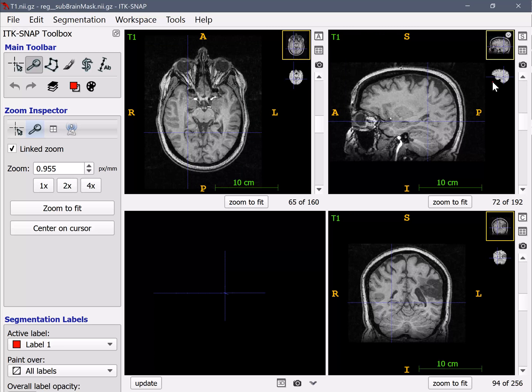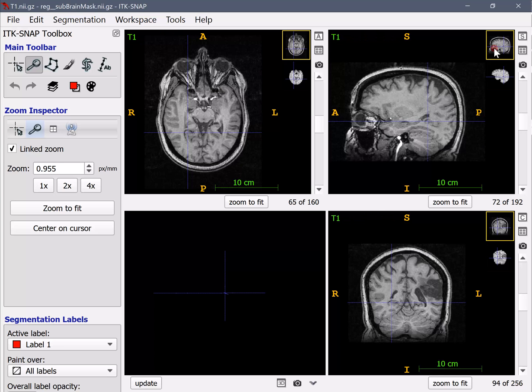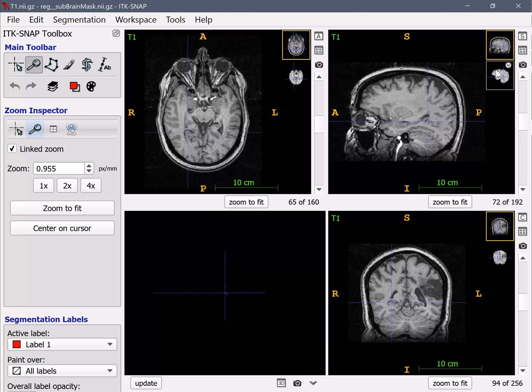We apply kind of a soft denoising because some images might be perfectly clear and nice. They might be obtained from modern scanners in 3T, others may be a little more noisy. Currently in LESYMAP, in the registered lesion to template function, I haven't put any option to choose how much denoising you want to apply. There is only a slight denoising applied, and that seemed to help as well to make the image clear. You can also see that here in the lesion area.